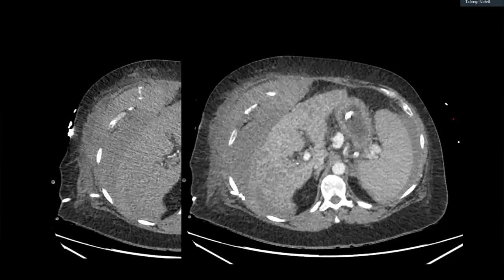It can be an arterial extravasation or bleed. Okay, so are you still calling this ascites, or would you like to call this something else? No, sir. This is hyper attenuating ascites. It can be a hematoma, pericapsular hemorrhage, because you can see some ascites here, and the density, as you can appreciate, is far different here.